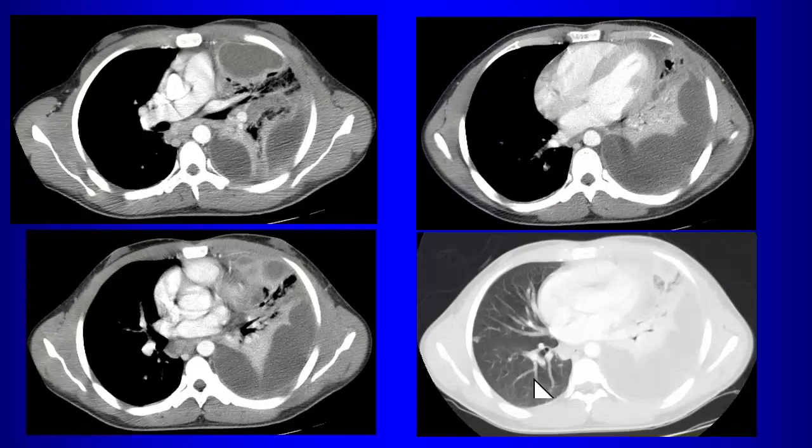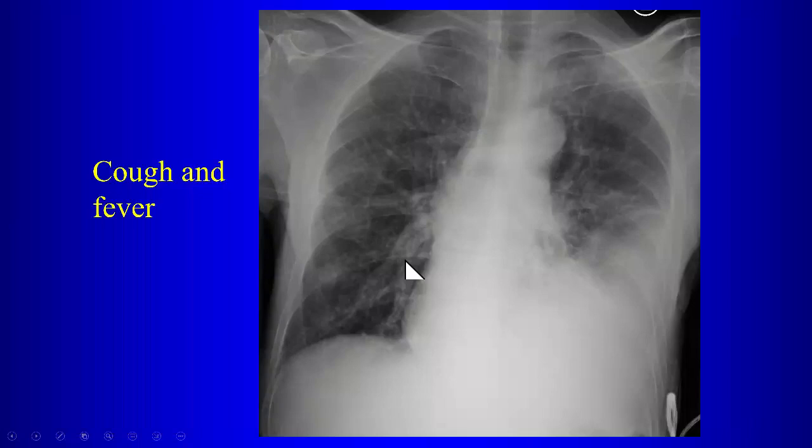Relaxation atelectasis. But what are the spikes? Why is it spiky like that? Those are adhesions, right? So with empyema, you can have a septated collection and the patient develops these adhesions. So it gives you this appearance on the surface of the lung from these strands of adhesions. Here too, there's adherent lung, okay? And then we have some consolidation here within the lung also. So this is a patient who had pneumonia and went on to develop empyema as a complication of their pneumonia. So loculated collections, septations like that, adhesions along the surface of the lung, all of that is consistent with empyema, right?